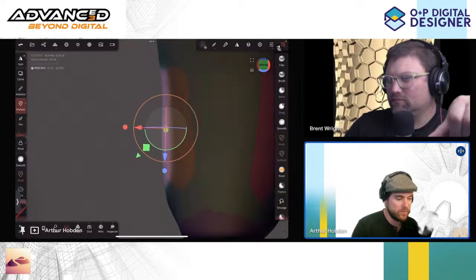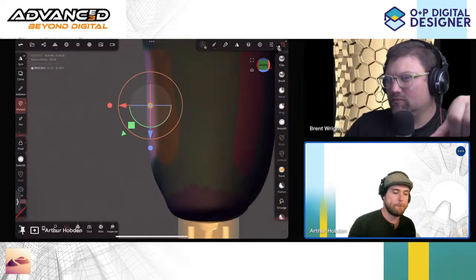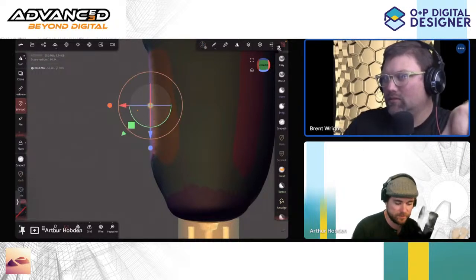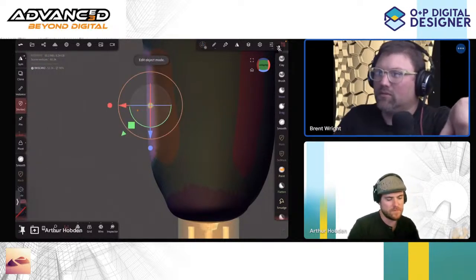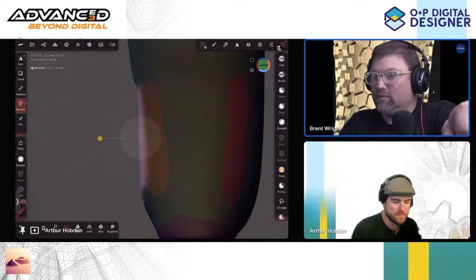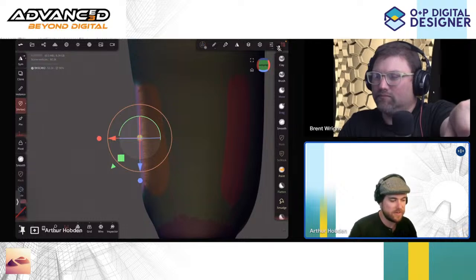So when you reduce this, would this be a flattening or would this be an actual translation? I have success with flattening. Up to you. Oh yeah, let me see. I think that looks good. Yeah. Just a little bit, right? It's just a little bit. Mm-hmm. Okay, so flattening, one-dimensional, awesome.